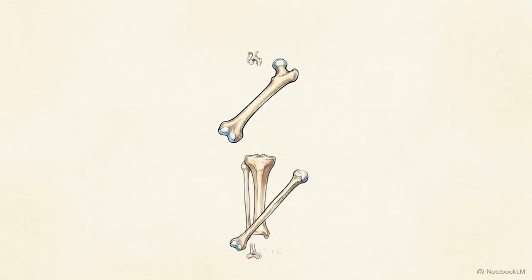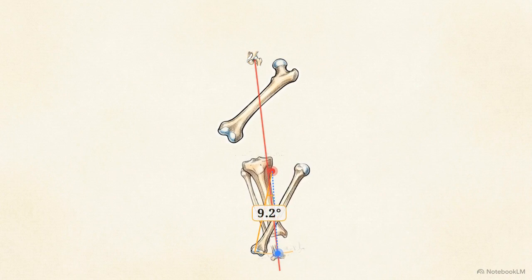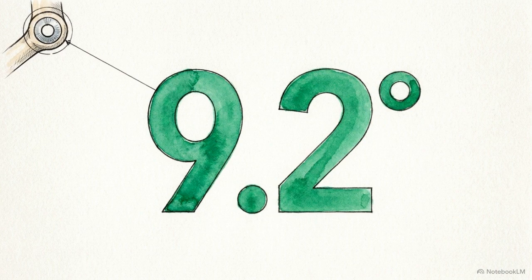The Miniaci method approaches this realignment as a geometric exercise in rotation. It calculates exactly how far the distal aspect of the leg must shift to meet the new Mikulicz line. The osteotomy hinge anchors at the proximal fibular head. The software maps the ankle's native position relative to this hinge, then projects its future position to align with the Fujisawa vector. The angle between the native and projected ankle positions dictates the exact 9.2-degree correction. The Miniaci geometry successfully abstracts a complex full limb realignment into one definitive rotational value required at the tibial hinge.